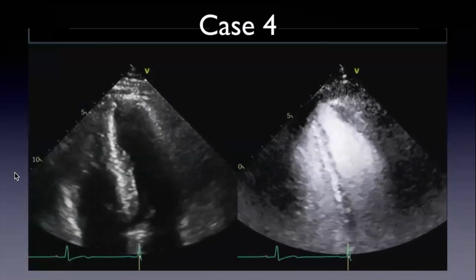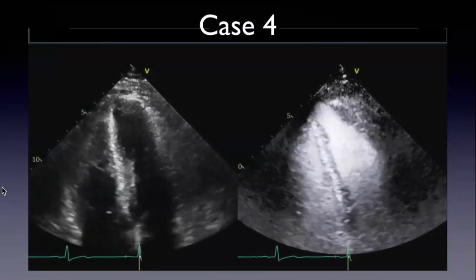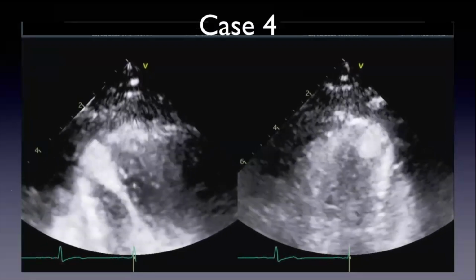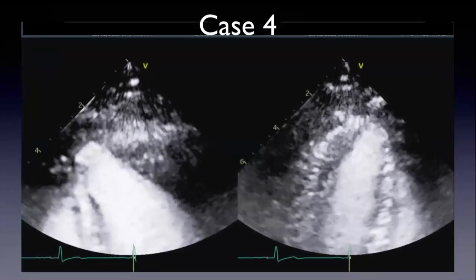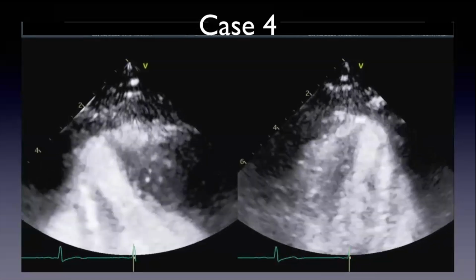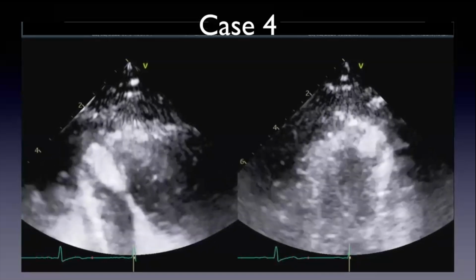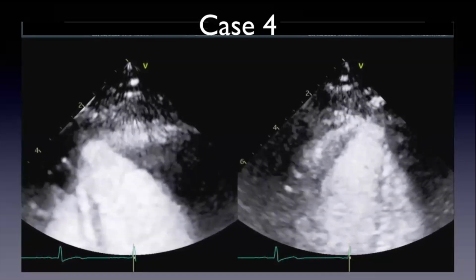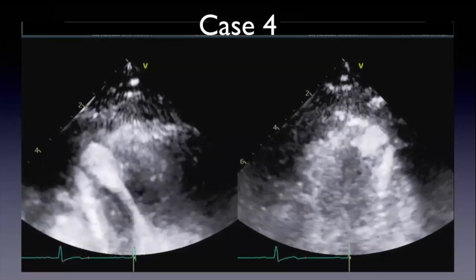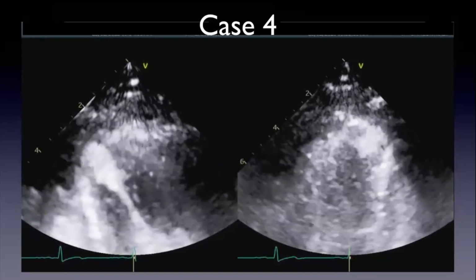Look how long this is, a very long left ventricle, right? This is a very focal apical abnormality. And here's a zoom view. Look at that. It's a focal apical aneurysm. Etiology unclear. I wouldn't call this a diverticulum. It's too big and it's not contractile. Whether this is a focal apical aneurysm because of coronary disease, ischemia or infarction, or as a result of burnt-out apical HCM, I don't think we can say for sure. It could be either one.